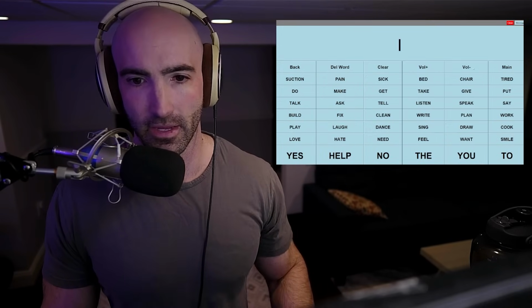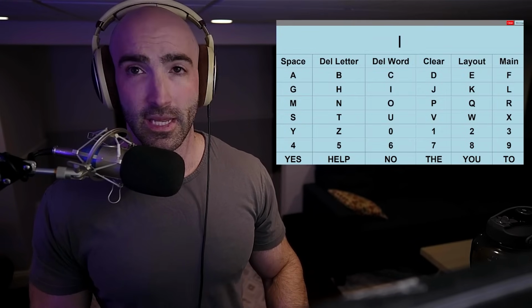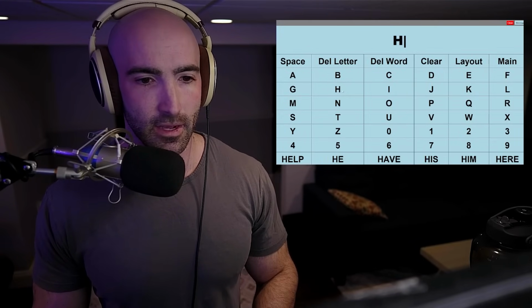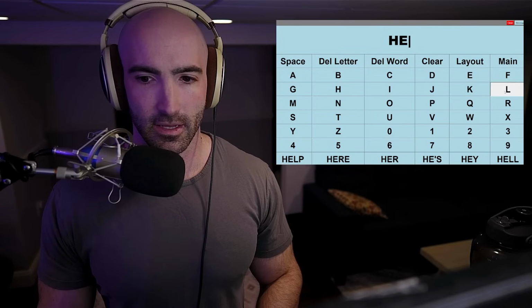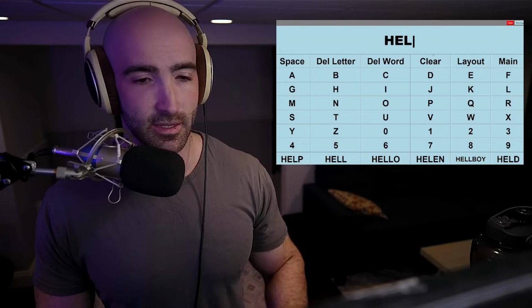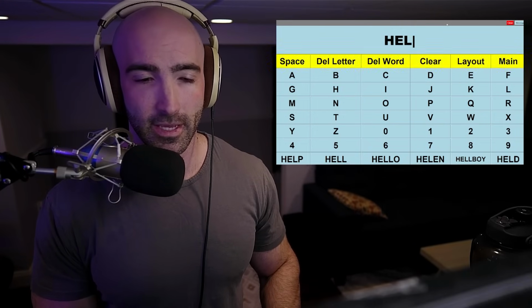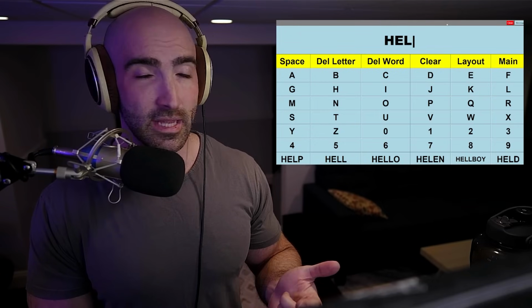So I won't go through everything on here, but we'll go back to the layout. When he types, so if he was to type something like hello, H-E-L, you'll see that at the bottom, there's a predictive text bar. To get to the predictive text bar for Ben, if you want to do it quickly, he just has to hold down the return key.